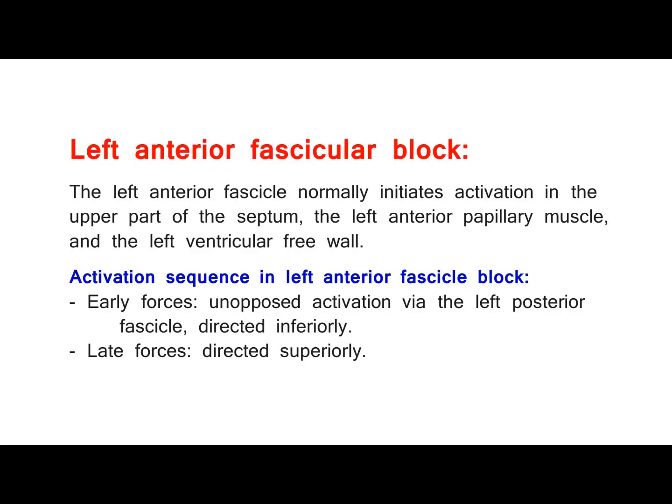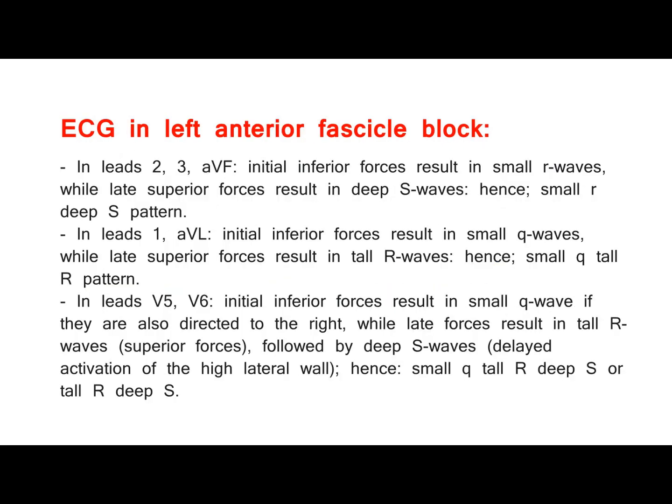Left anterior fascicular block. The left anterior fascicle normally initiates activation in the upper part of the septum, the left anterior papillary muscle, and the left ventricular free wall. Activation sequence in left anterior fascicle block. Early forces: unopposed activation via the left posterior fascicle, directed inferiorly. Late forces: directed superiorly. ECG in left anterior fascicle block.